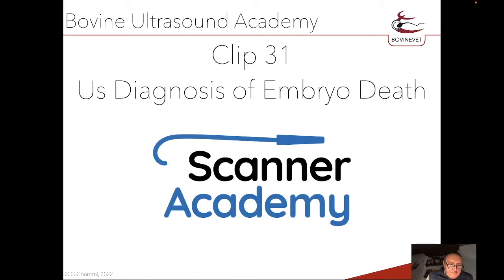Good morning. We reached the last episode of the chapter dedicated to early detection of later embryonic death and early fetal death. It's been a long way, a long trip, and I hope you have also found it interesting. Today, I would like to talk to you about causes of embryonic death that we may actually call fake news, and how ultrasound allows us to uncover these fake causes of gestational loss.